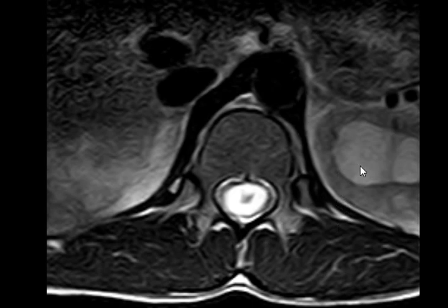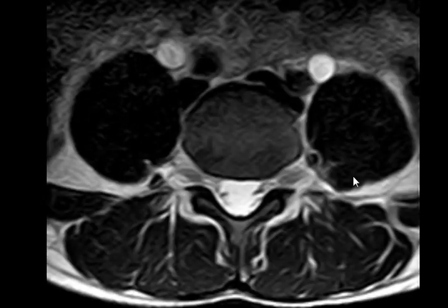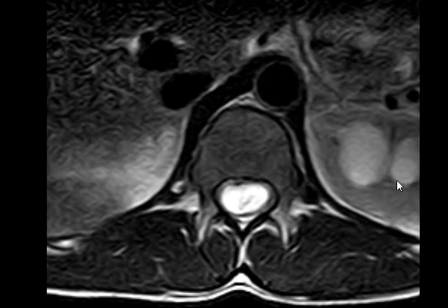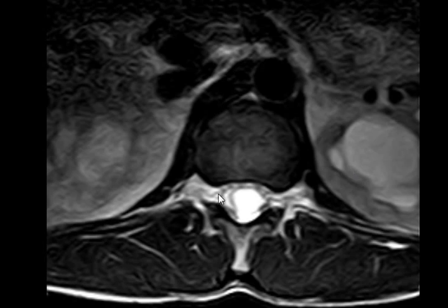Huh? I don't know. You are the reporting radiologist, not me. What's going on? Cystic lesion. Okay. Two cystic lesions. Okay. At the right iliac fossa. Right iliac fossa. At the left. Not right, not iliac fossa. Not left. At the left bottom. Do whatever you like.